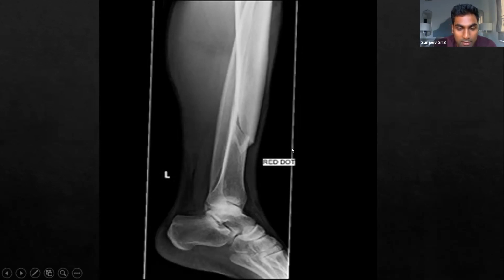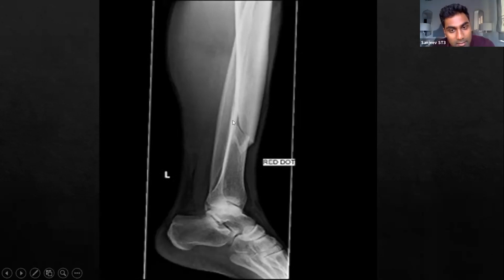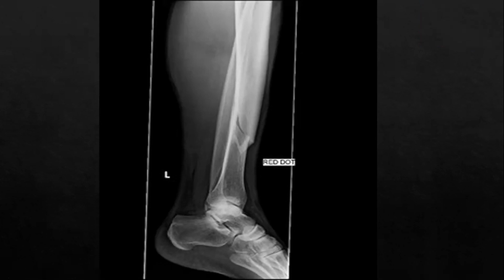In terms of other things you could have mentioned, remember to describe the deformity. In this case, probably the reason you didn't mention it is because there isn't much deformity. But just remember to mention it, even if it's minimal. What I meant is the deformity of the bone, of the fracture. The way I would describe this is there is a distal tibial fracture which is minimally displaced. That phrase, minimally displaced, is quite handy because it puts all those things together and tells the examiner, actually, I've assessed the deformity, there isn't much.